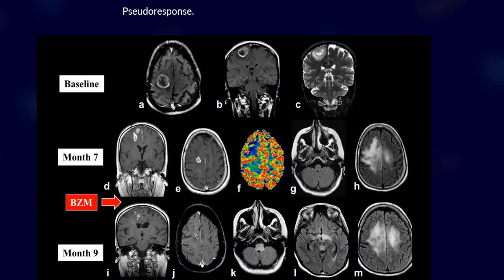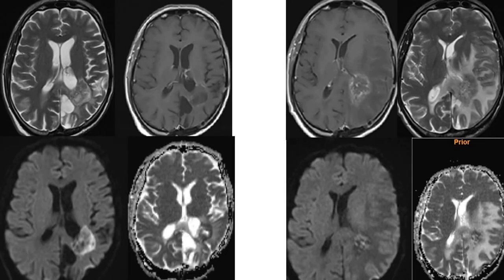So also we have to differentiate this glioblastoma multiforme after chemotherapy, regression of the enhanced component, but later on the extension of the lesion in a diffuse manner to the hypothalamus and brainstem. This is one of my cases, glioblastoma multiforme under chemotherapy.